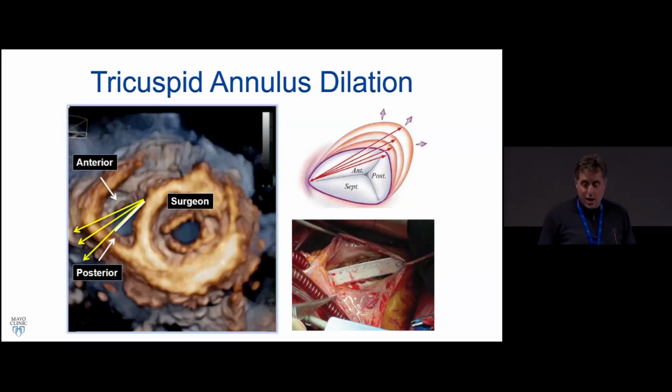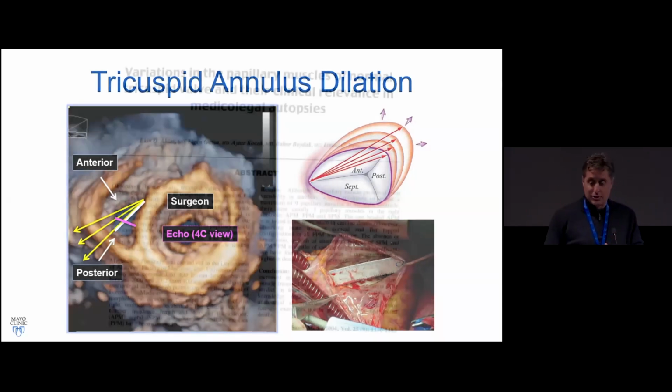We as echocardiographers are measuring more of this sort of medial lateral annulus. It's not even the direction in which the annulus dilates. And really, we have no good ways from 2D echocardiography to measure the tricuspid annulus. It's a bold statement, but there's really no good, reliable, reproducible way to do that. But that's why there's the difference between the surgical and the echo literature.